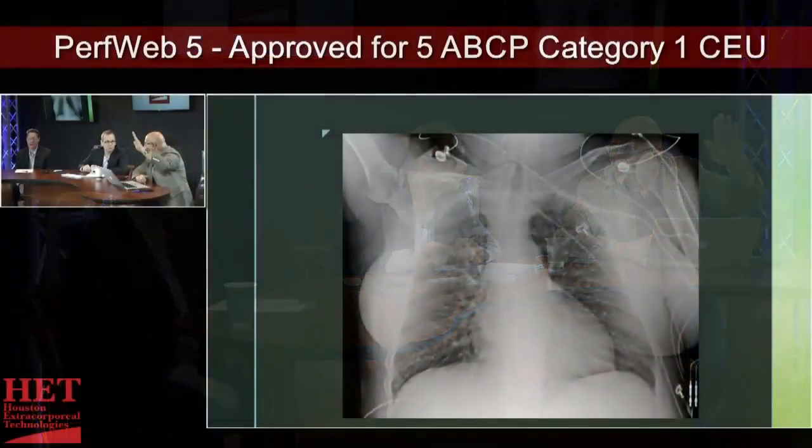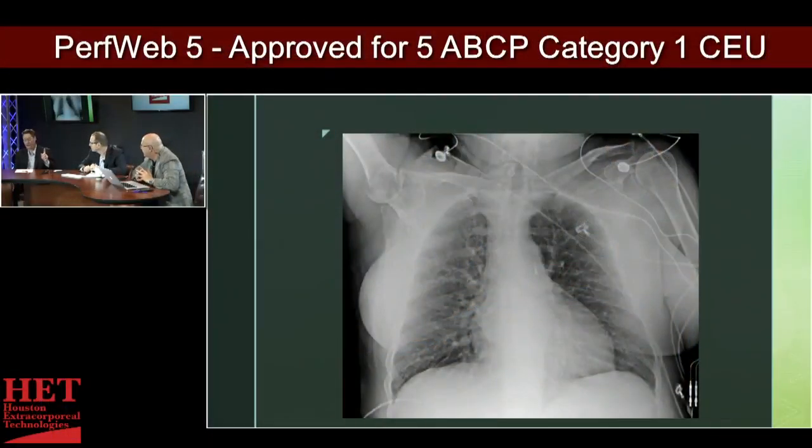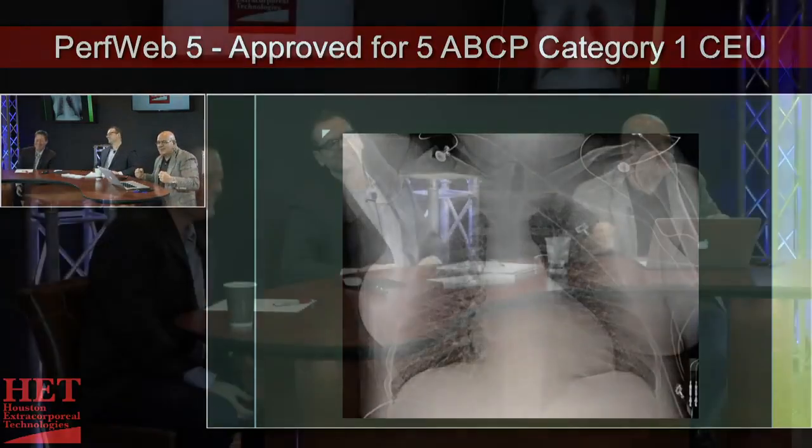Okay, Joe, I will take one more guess. I'm not going to guess what it is, but I'm going to say it's not a foreign body. Sure. For sure. Okay, go ahead, Joe. It's the tip of a balloon. It is. All right, now it makes sense.